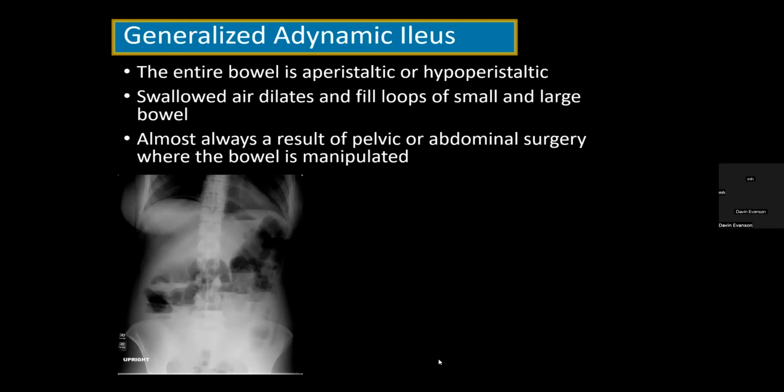A lot of times the stomach is dilated too. You often have a history of a recent surgery. And there's some free air under the diaphragm. We'll learn about that with a lot of burps and farts, but always looking for free air under the diaphragm.